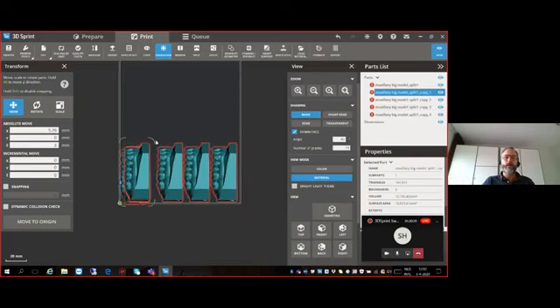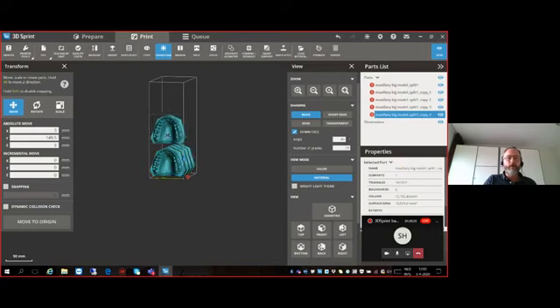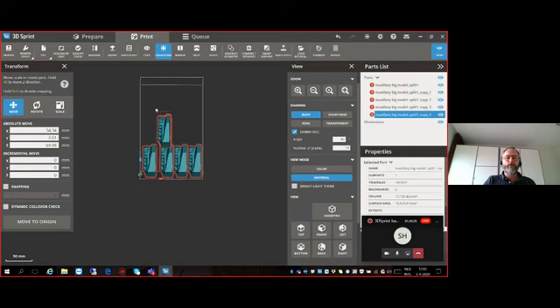It will stack them. I will try to show here, but that will be done automatically by the software until the total Z-axis is used, and therefore within this new software package, when it comes to orthodontic models, you can print up to 25. I've already seen our testers print 30 models in about 1.5 hours.